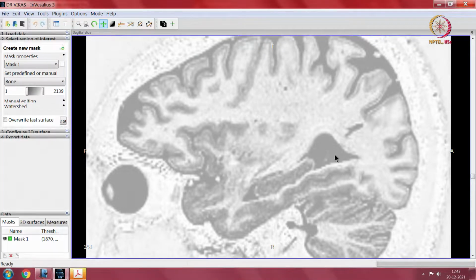This is the temporal lobe. So, this is the frontal lobe, parietal lobe, occipital lobe, temporal lobe. In the temporal lobe is the continuity of the lateral ventricle, the temporal horn, and then this is the hippocampus. You can see one structure here projecting into the temporal horn, and that is the hippocampus.